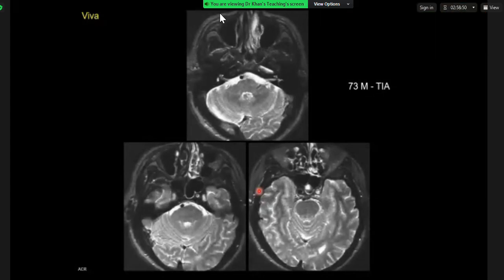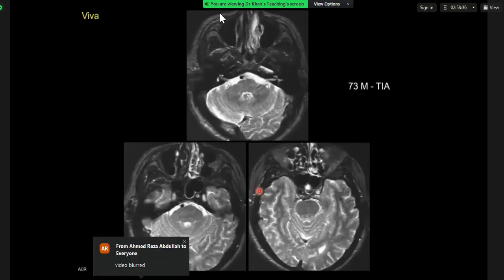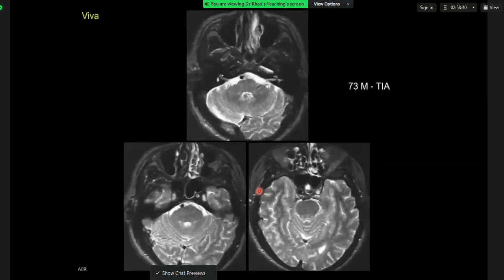Okay, so I'm presented with axial slices of the inferior brain that include both basilar and ICA. There are normal flow voids seen in the basilar artery, but bright signal in the left ICA, concerning for an absent flow void and thus thrombus.